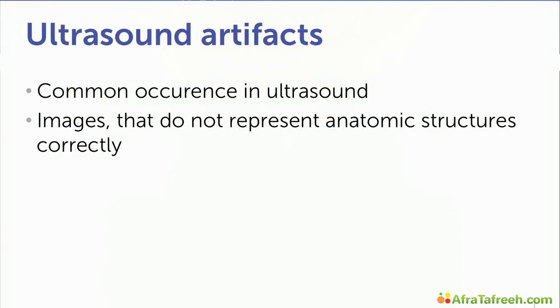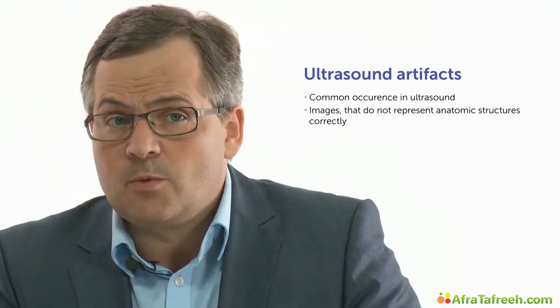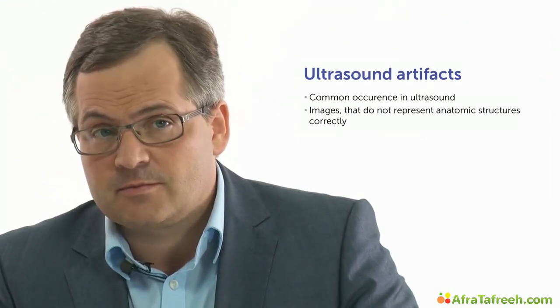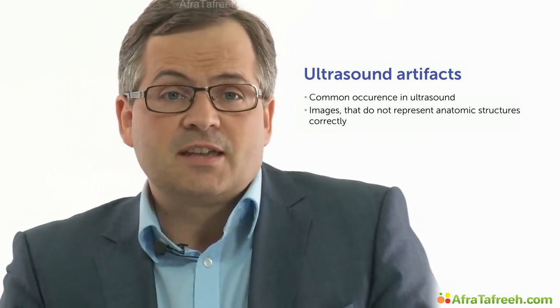Ultrasound artifacts are a common occurrence in ultrasound and can be friend or foe. When we don't recognize them, we may misinterpret our pictures because they produce images that do not represent existing anatomic structures. It is important to know and to distinguish them so that we don't get wrong information out of our examination that could lead to a wrong diagnosis.